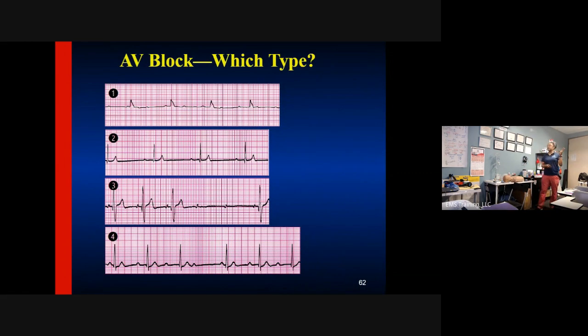Are you going to tell me in the chat which types of blocks these are? Which type of block is 1? Which type of block is 2? Which type of block is 3? And what type of block is 4? You can put that in the chat. We'll talk about it later.